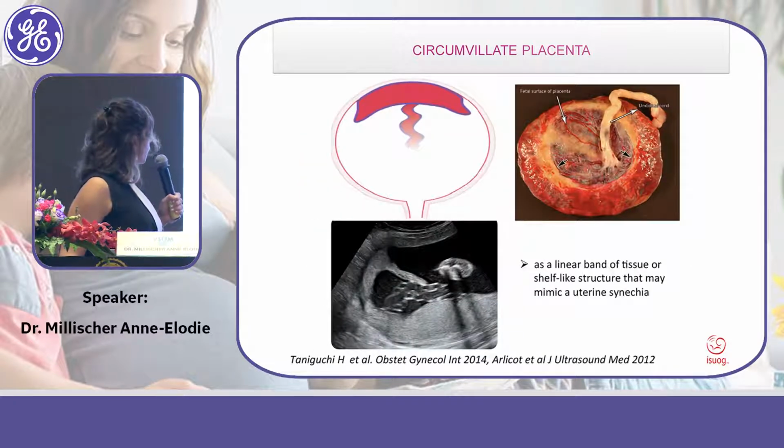This kind of placenta provide this aspect in ultrasound, and it could mimic synechiae inside the uterus.